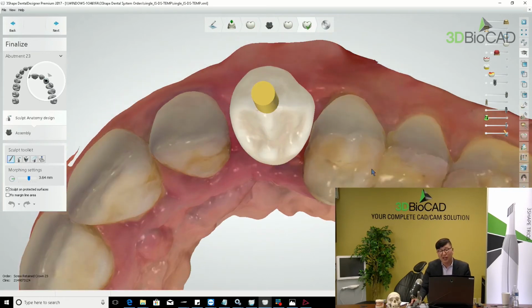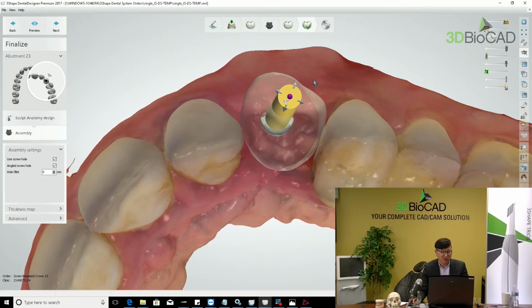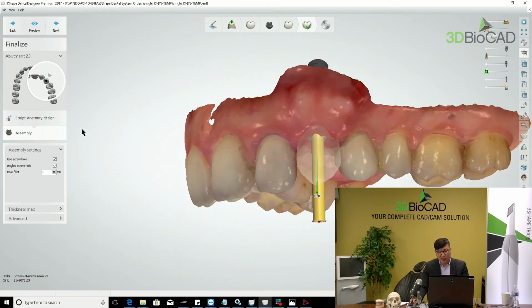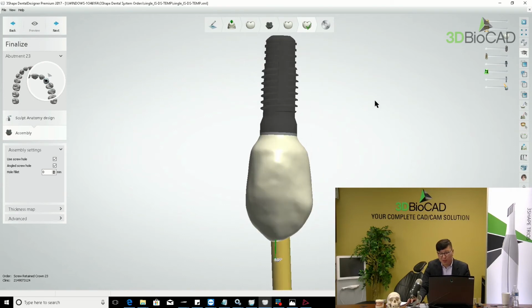So at the end, if you set the titanium base kit as the angled screw channel one, we can just use the angled screw channel here too. Okay, and then design it, and we can just mill with the PMMA. We know that part. So your question can be like, Jack, I know that, why do you just keep telling me? So my point is like this.